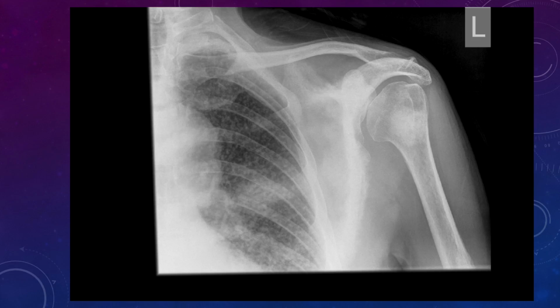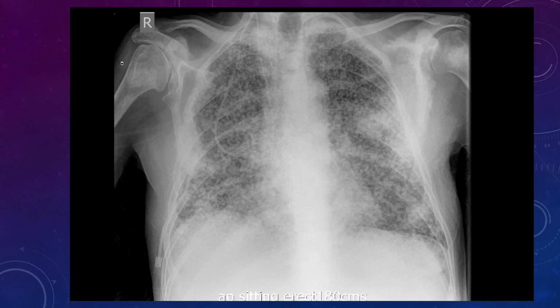It doesn't look right at all. And then when we go into the lung fields, we've got multiple small nodules, sort of miliary, all similar size. So we looked at this and it's like, okay, there's something serious going on here. So we're going to have a chest x-ray. Let's see what's going on in the rest of the lungs.